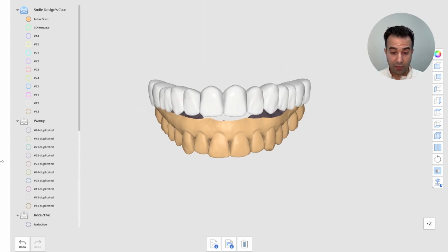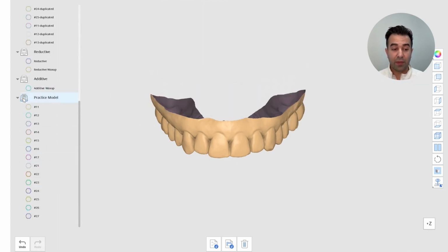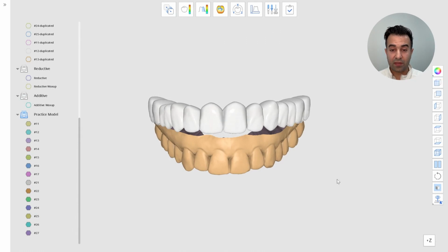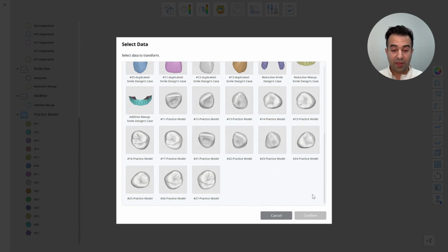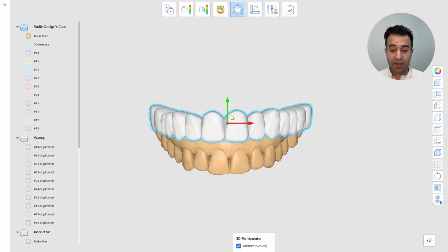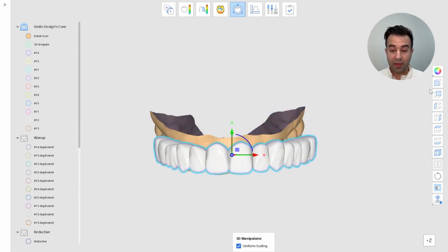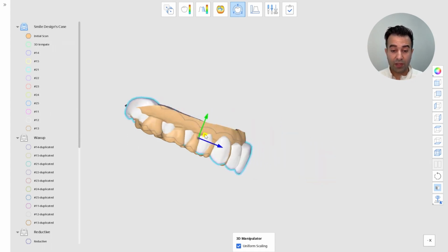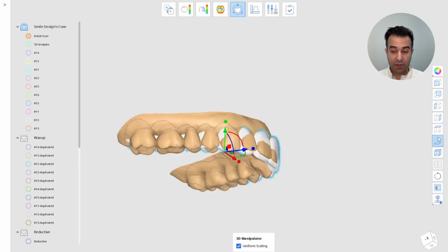And that was the webinar of the previous one. Step 1 was importing a 3D teeth library, and one step is done. And the second step was using the transformation mode to scale and position these 3D teeth library in a favorable position within the arch. And that's how you can customize your 3D teeth library for all your cases, because technically you can change the shape and orientation of these teeth to your desired shape and position.